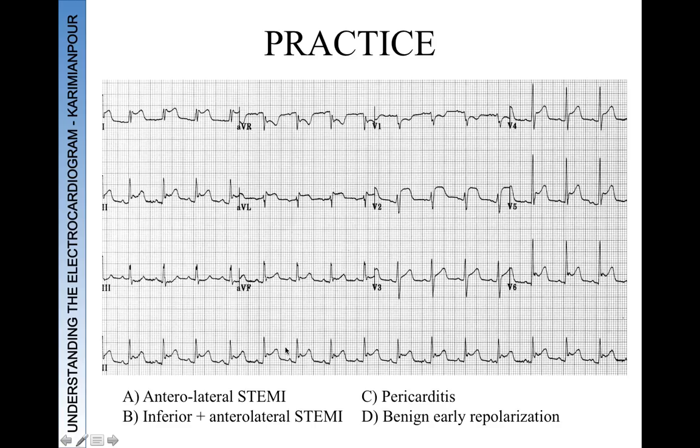But I think what's obvious here are the ST segment elevations across all of the leads. So limb lead 1, limb lead 2, 3 doesn't have any ST segment elevations, but AVF, so the inferior leads, have ST segment elevations, and look at the morphology of them. There's sort of the strain pattern, the upsloping ST elevation, AVL across the precordial leads, and then V1 and AVR have ST depressions.